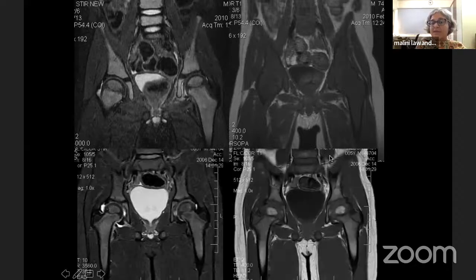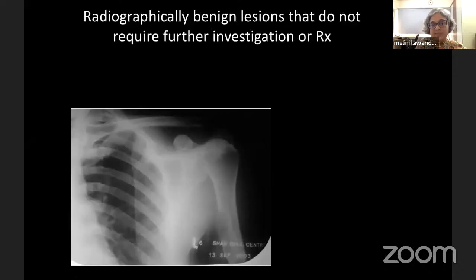And just to show, in the same age normal child, this is the normal fatty marrow in the femoral head. This is red marrow, which can get confusing. So if I just look at STIR, I'm not sure, is this red marrow or not? But I look at the T1 weighted image, it's very dark. This is leukemia. And we obviously don't want to miss this.